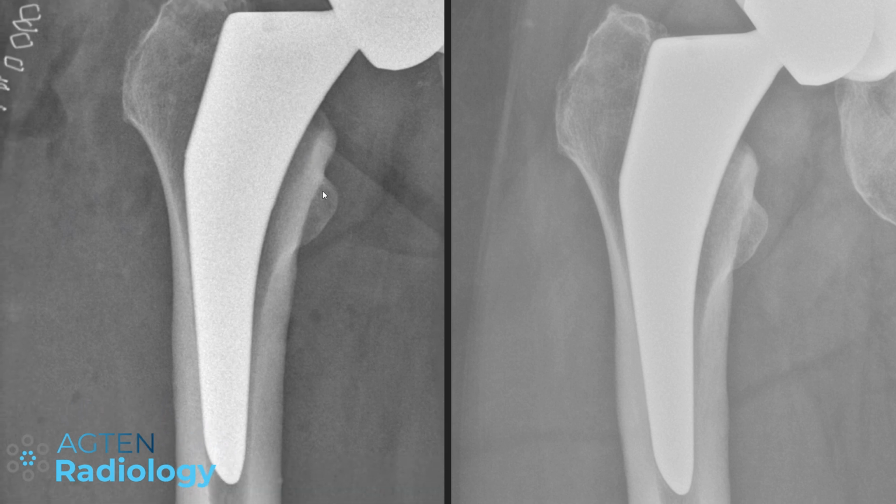So it's very subtle, and I'm not sure whether it's easy to see on the video here, depending on whether you're watching it on a mobile phone or not, but there is a clear thickening here at this location, which is not the case here. And also there's this bulging of the cortical bone here in the sense of a solid periosteal reaction, and there is absolutely nothing here. We don't see a fissure or anything like it.